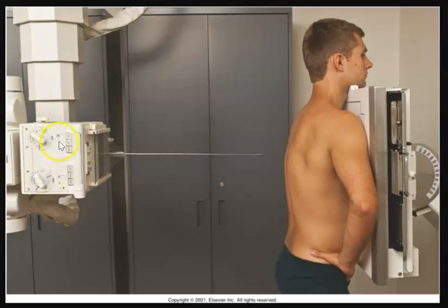This over here is the X-ray tube. This you're going to move all around the room and in different orientations, different ways to get to the patient. It's going to be this equipment here that changes the electricity we get from a wall outlet into actual X-rays. You're going to change technique. There used to be dials on this little bit older equipment. Now it's mostly just electric.